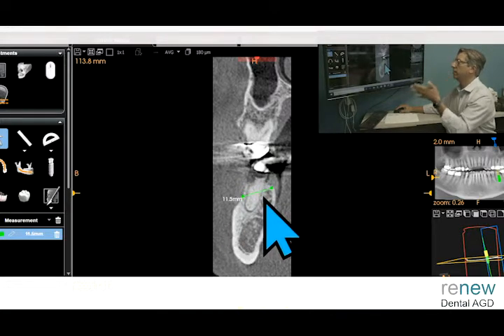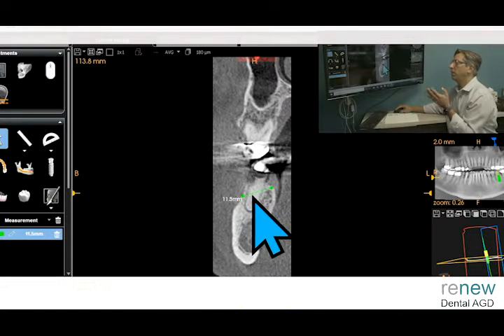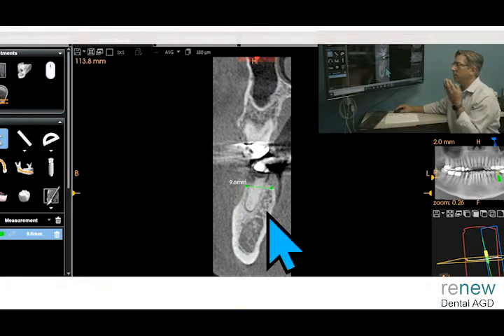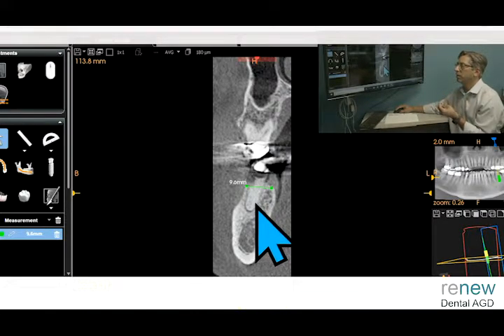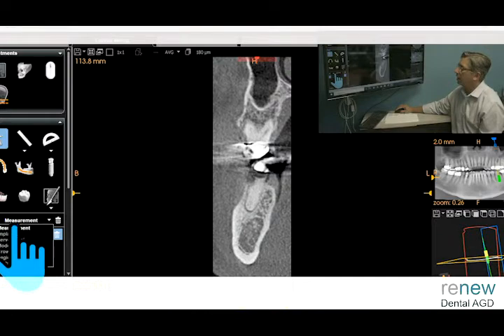And now if you did an immediate placement implant, you might have an exposure of the top area of that particular implant. So you want to wait and see if you can manage that bone from a shape perspective, so you know where that implant actually has to go more accurately, based on the dimensions of the new bone that's growing in there. So that's a pretty straightforward case. I can't think of any other real thing that I look at in this case before I start.